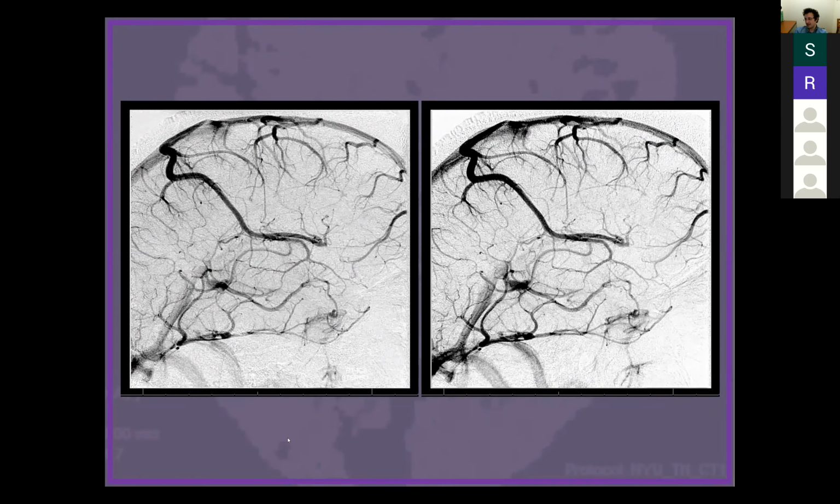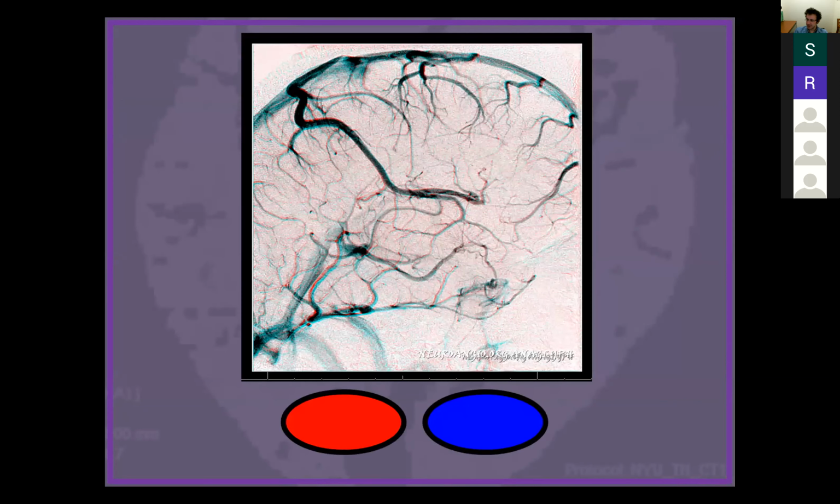That's how we do it. When you're doing it in real time, you take these pictures, you put one as a reference, you put one next to it, and then you look at them that way. It's particularly helpful for the veins when you're trying to see which veins are deep and which are superficial. If you're not sure, that's one way to do it. And that's the same picture. If you use your glasses, you can see there is a sense of depth over here, right?